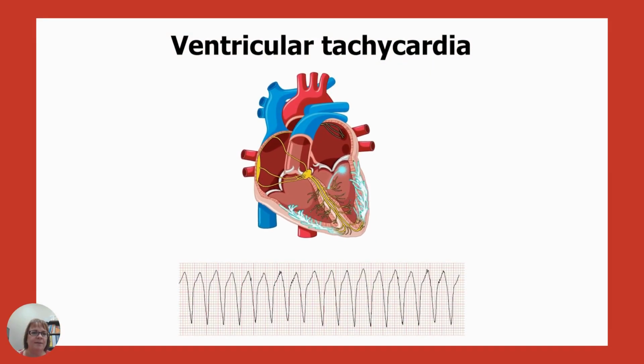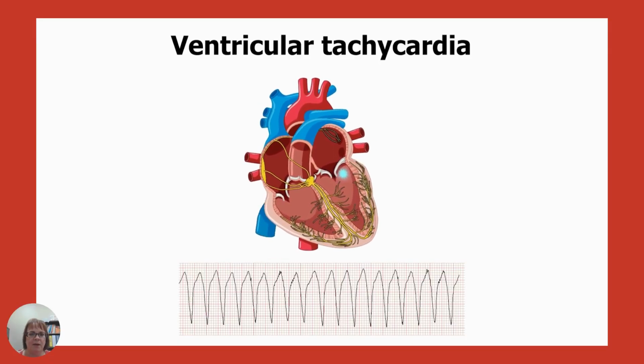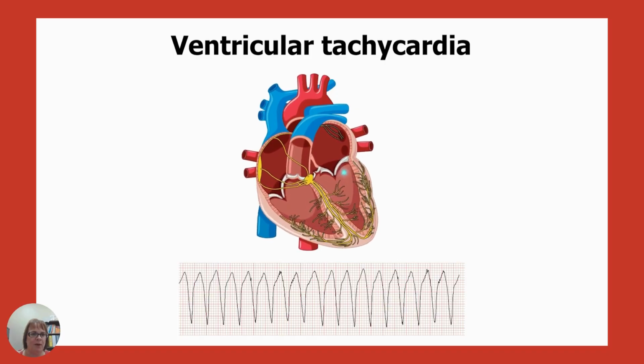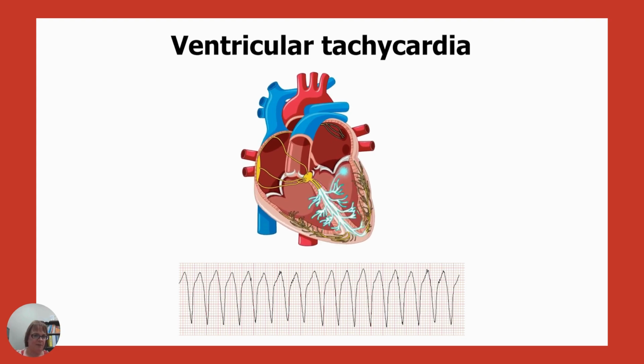VTAC. What's happening with VTAC? I have all of these huge, big, tall V's. Okay, and I don't have many P waves. The ventricles are just pumping, pumping, pumping, but there's no blood that the atria gave them.